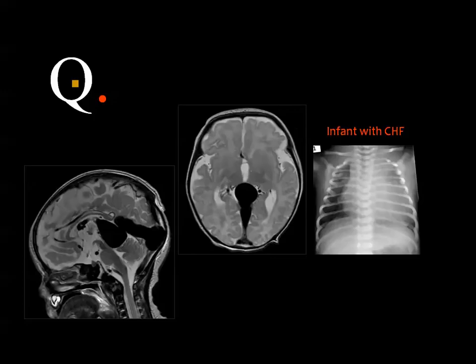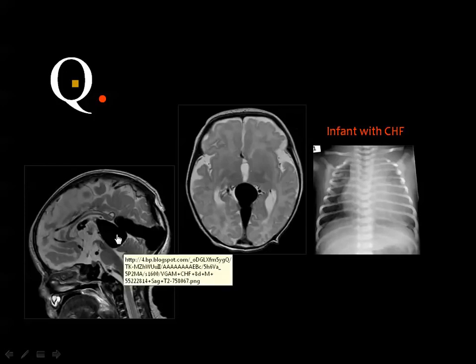It is the vein which is the precursor of the vein of Galen, known as the median prosencephalic vein. There is a fistula between this vein and the choroid arteries, resulting in a severe increase in pressure within the vein, leading to its aneurysmal dilatation.